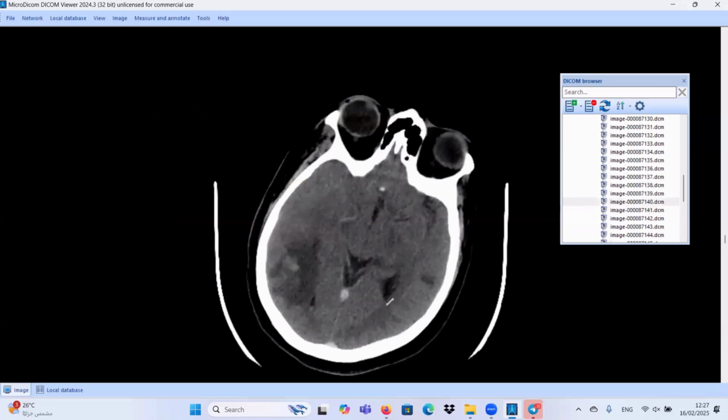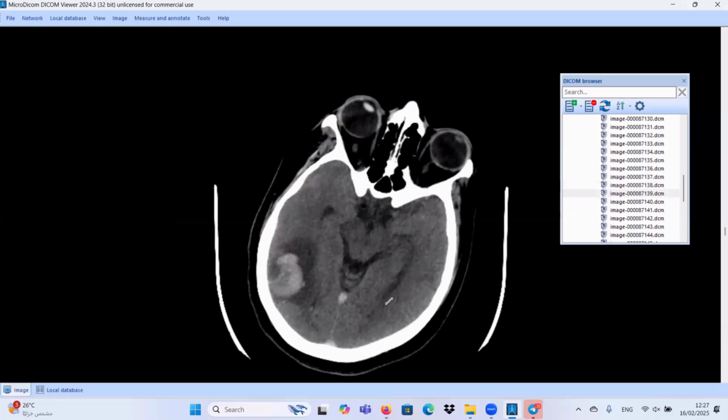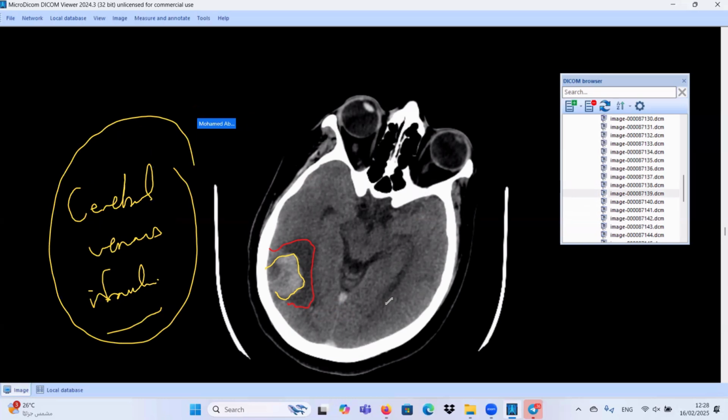Also, we can explain this intracerebral hematoma and this brain edema as cerebral venous infarction secondary to cortical vein thrombosis. This is the most logical thinking in this case: acute dural venous sinus thrombosis, cortical vein thrombosis and engorgement, and secondary intracerebral hematoma and/or cerebral venous infarction.